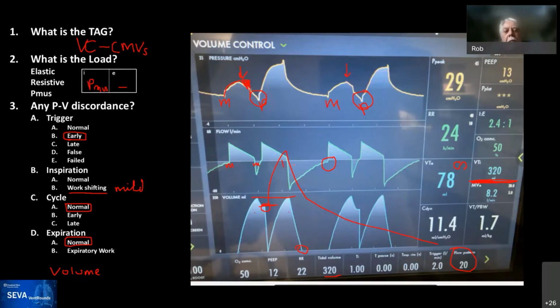Exactly. And there's no alarm. To my knowledge, there's no ventilator currently that alarms under these circumstances, that first recognizes a multiple triggering event and alarms for it, because it's relevant regardless of the mode. If you have multiple triggering, it could be a leak, it could be disconnection, it could be early triggering, early cycling, you name it. There's some action that needs to be done by either the ventilator automatically or by the caregiver.